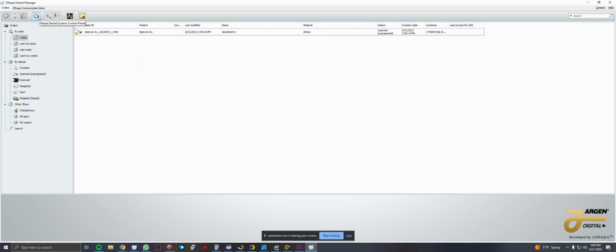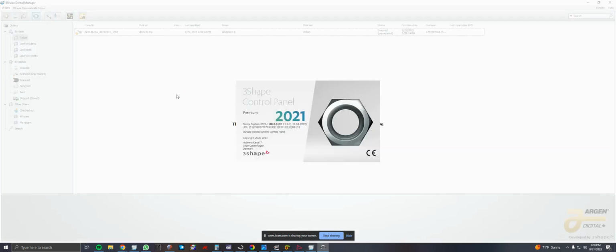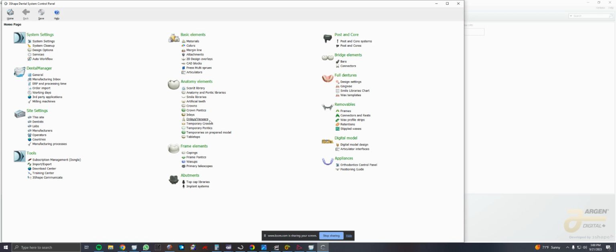So first thing you want to do is make sure that the libraries you're going to be kit swapping, which is what I call it, correspond to each other and that they line up correctly. And the easiest way to do that is actually just hop into Control Panel.